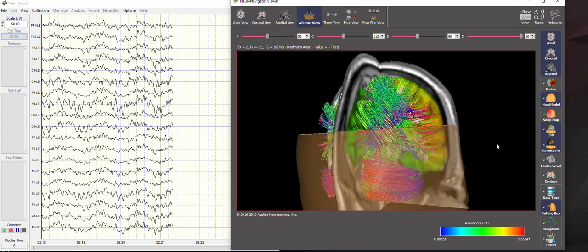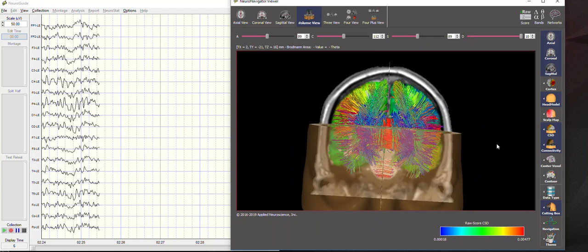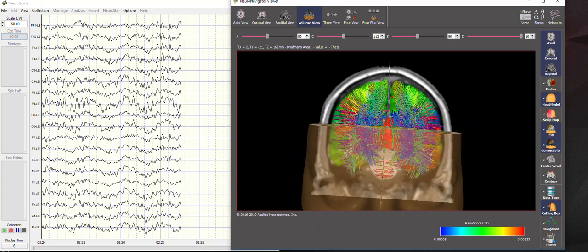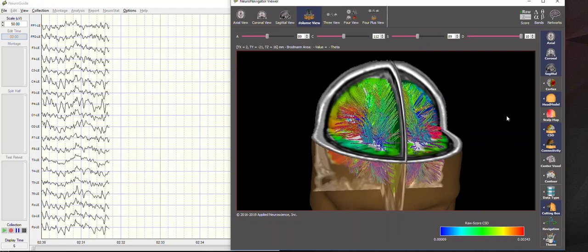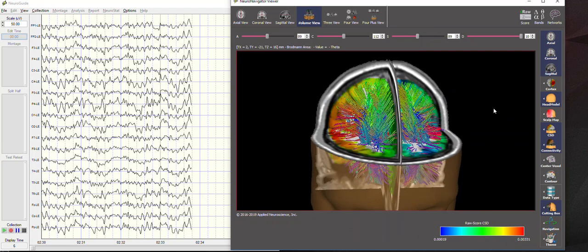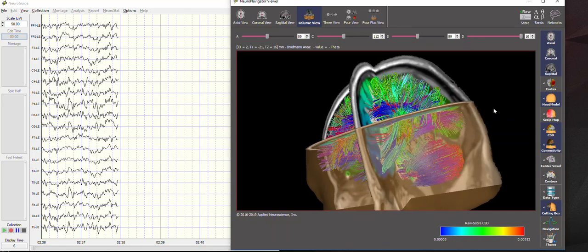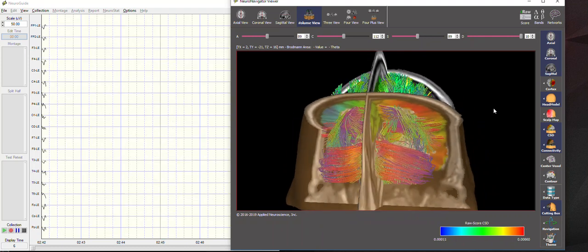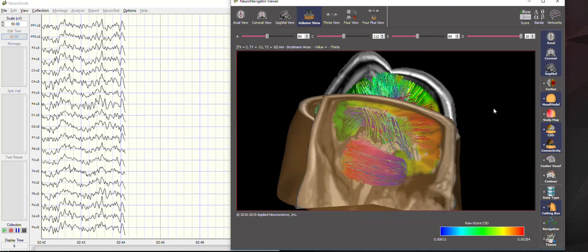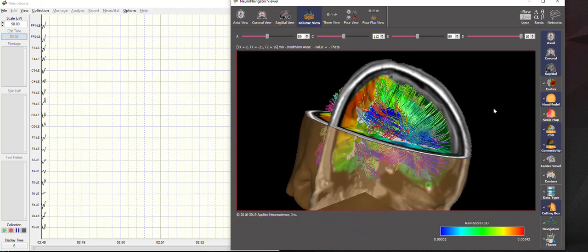So this is just a way to add another view to an individual who's visually examining the EEG traces and then wants to be able to add and augment that visual examination with a more statistical, intense visual examination of the traces for their own, to facilitate evaluation of the EEG using visual examination.